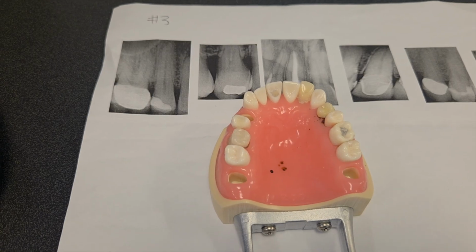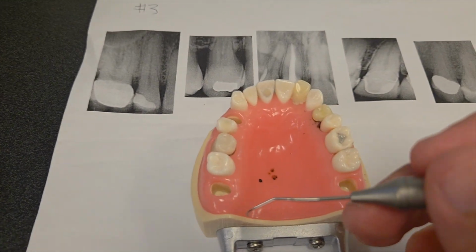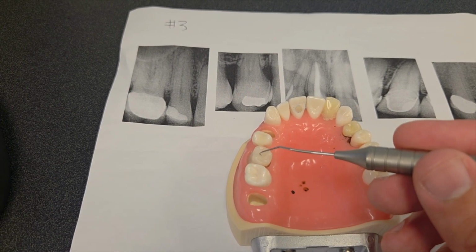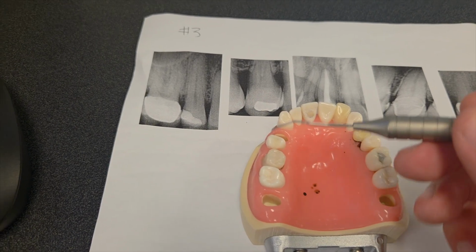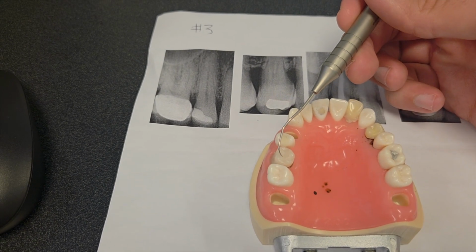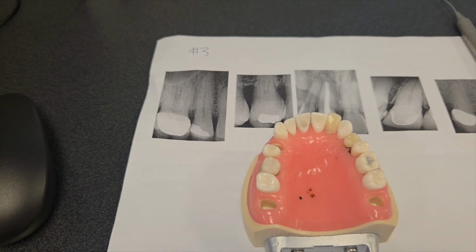Going back to our model, again, we charted all those missing teeth. The next thing we're seeing is a normal tooth. This is a normal molar here, second molar. There's nothing on the x-ray. Now this tooth here, we have something. This first molar, number 3, we can see on the x-ray that there's a porcelain fused to metal crown on this guy. And that can be seen on the EOIO as well. So we will chart this porcelain fused to metal crown next.